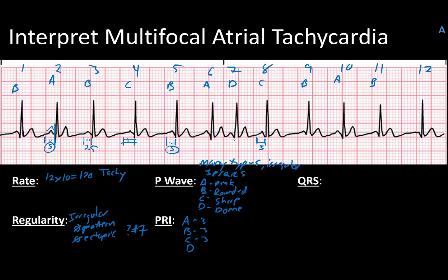Last but not least, we'll measure D, which doesn't even have a PRI, which is kind of weird. None of these have a PRI, which makes it kind of odd. But still, it's that different conformation, repeating pattern, leads us to look towards something else. So I'm going to make that one a 1, 2.5. So that one, times 0.04, 2.